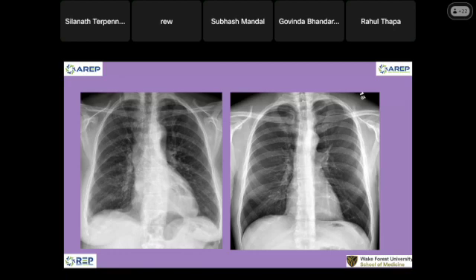This one is the aortic arch. Look at my patient. The patient has a stomach on the right, and our aortic arch is on the right. Does it look like it has a lot of atherosclerotic disease? No. The aorta is losing elasticity and it's not really hard. So the trachea is going to the left. You can see that, this is the mediastinal mass.